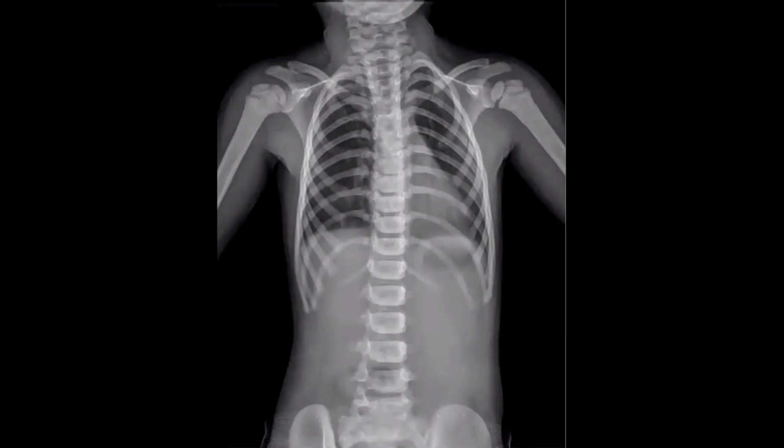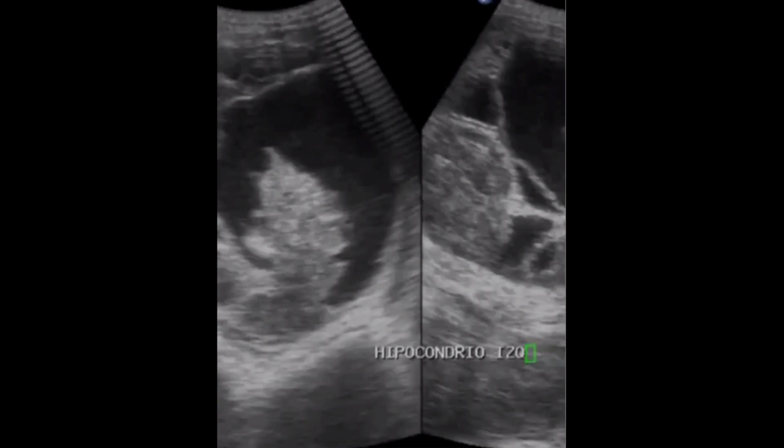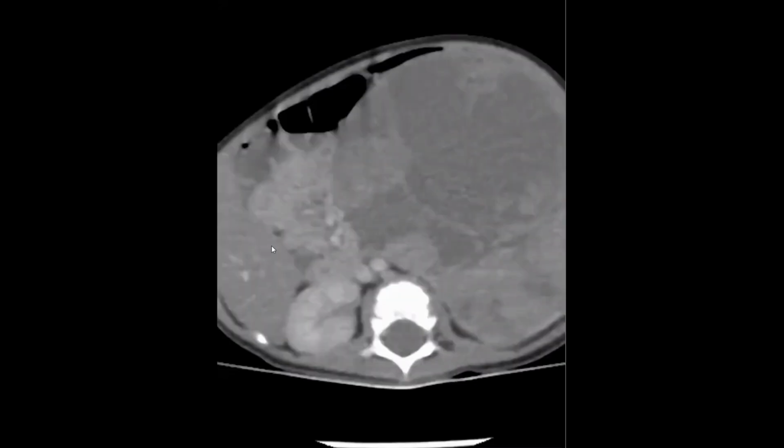Take your time, doctor. Okay, let's go to the CT and see what we have.